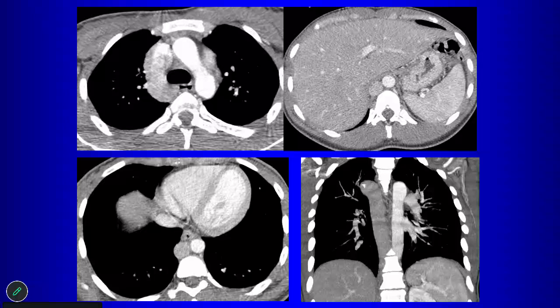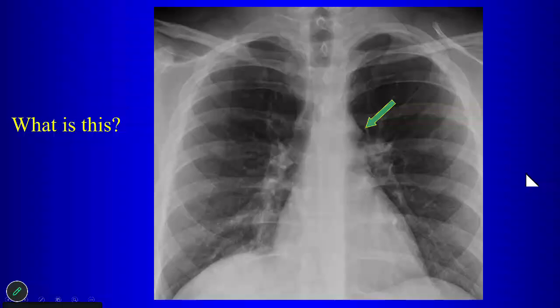Sorry. They form a smaller IVC, which you can see right here. So the hepatic veins form a smaller IVC, which then drains into the right atrium. So the key to making the diagnosis is absence of the intrahepatic inferior vena cava. Okay. All right. An R2 favorite.